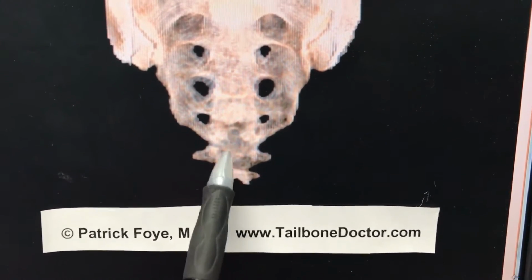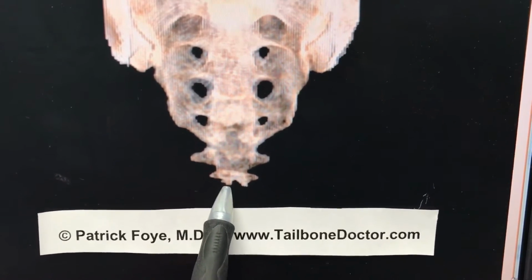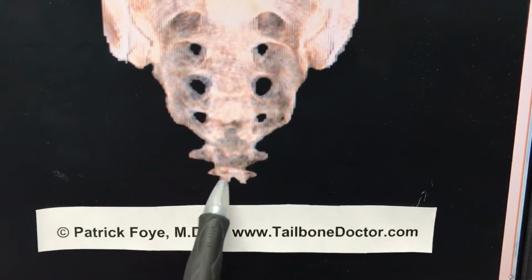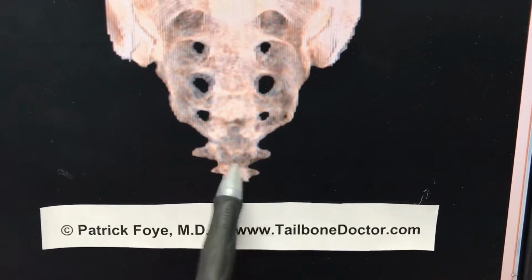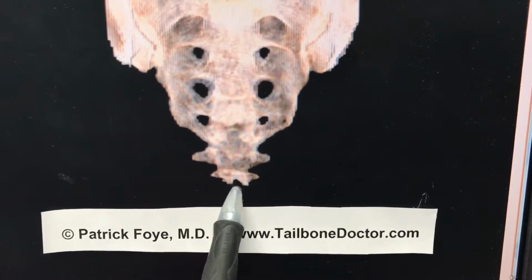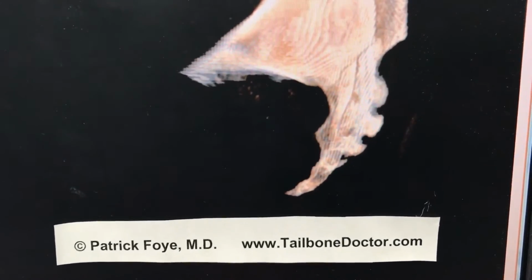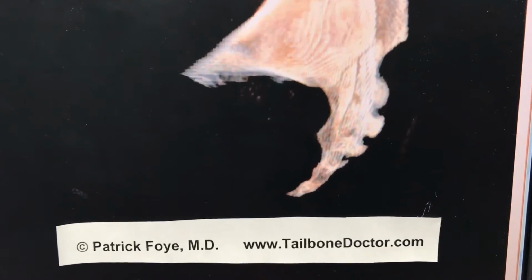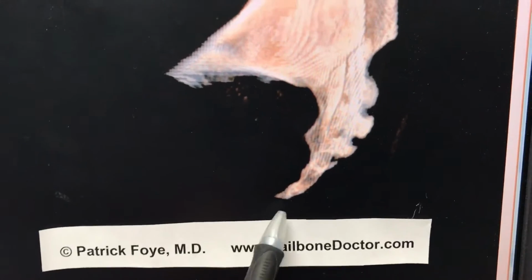So the rectum, the colon, other organs within the pelvis, and stool within the colon can make it difficult to see that lower part of the tailbone well on that view. But then you go to the side view on the X-ray, which would look something like this, not quite, but similar.